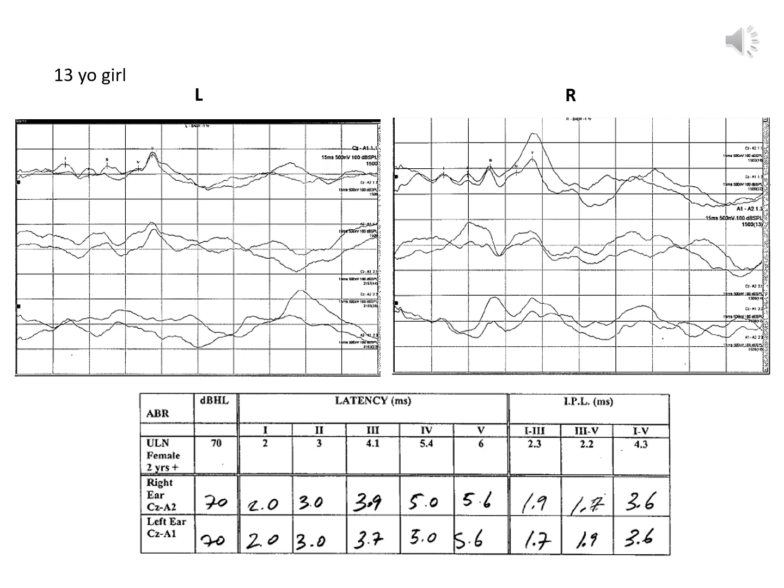Now, in a normal recording, the waves 1, 3, and 5 should all be approximately the same amplitude. And so this amplitude differential, where the wave 1 is more than 50% smaller than the wave 5, is clinically important. And when we see this pattern, it typically indicates a sensorineural hearing loss in the ear that shows this pattern.